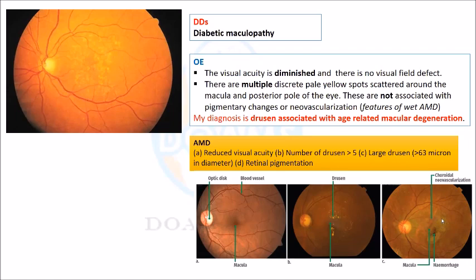So it's very difficult to comment, and practically it may be an important picture in the part 2 exam, but not for patients, because clinically the patient will have very rapid loss of vision from the transformation of a dry AMD. Can you understand my word, Doctor?